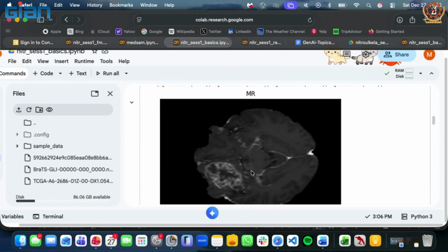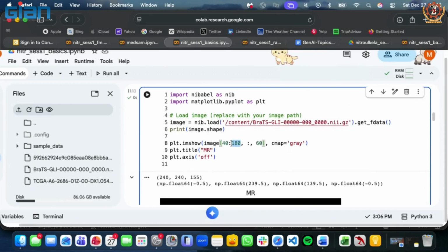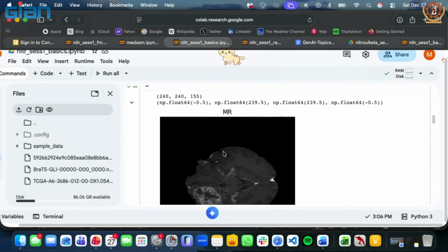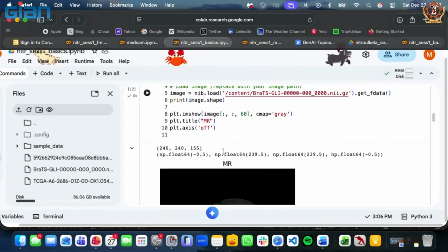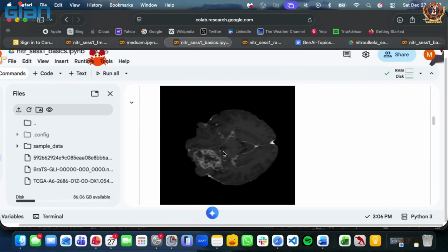So why this comes handy is, if you upload this image and feed it to a machine learning model, the model is learning many black pixels, which you don't want. You just want to crop the image so that it has only the MRI and then feed it to a model. So this array slicing, or this list of lists slicing, comes handy. So this is how you plot an MRI.